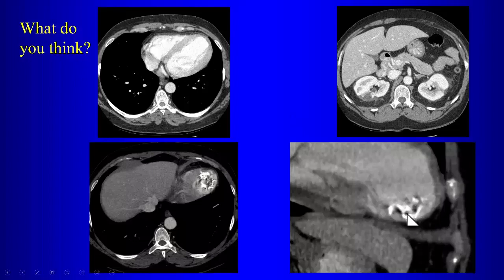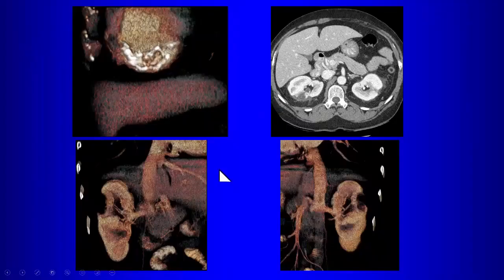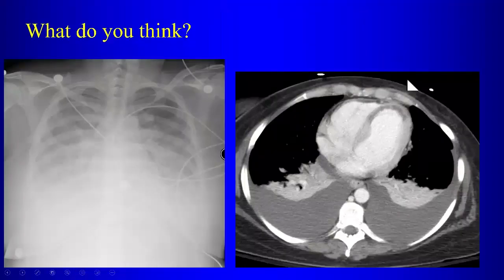So when you have chronic thrombus, it can go on to calcify. So this is chronic thrombus here within this true aneurysm, and a complication of this are these embolic infarcts that have occurred there within the kidneys. And then here are some volume rendered images showing you the calcification, and then these are the infarcted regions there of the kidneys, okay?